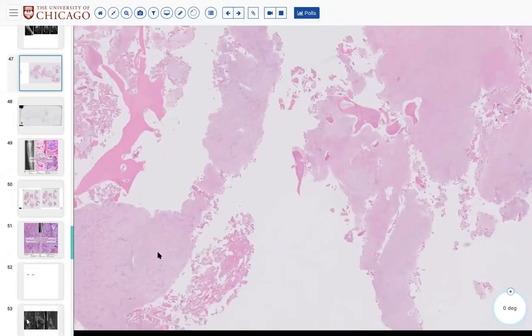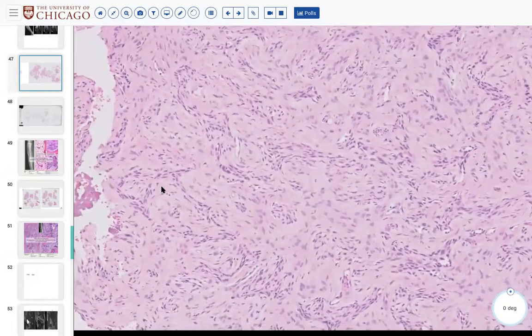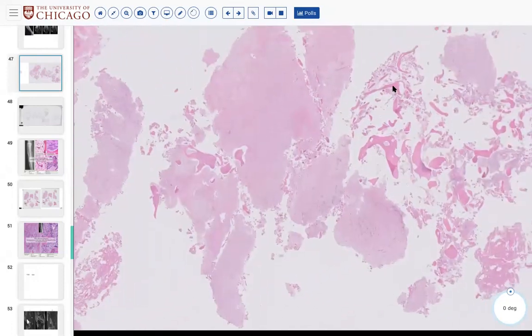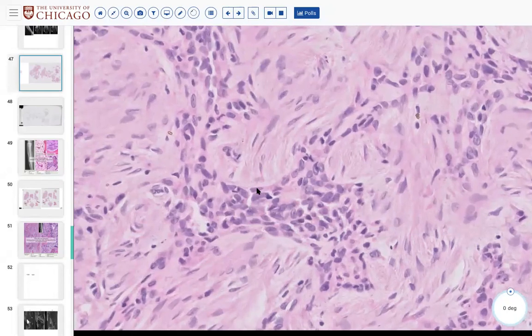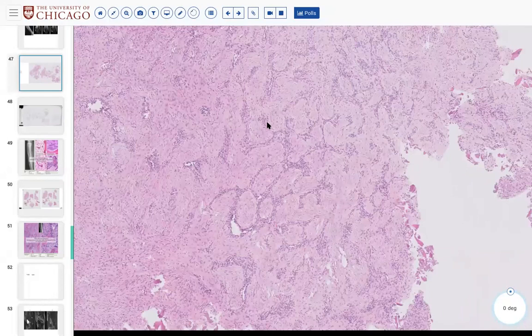But when you really evaluate the tissue thoroughly, you'll see that these compressed islands pop up here and there. On occasion, you may think, are these compressed blood vessels? And on occasion maybe they are, but some of them don't really have lumina. In that area over here, which I think is probably the best, they are multi-layered. You really wouldn't expect an endothelial vessel to have 1, 2, 3, 4, 5, 6 cells across as a cord. So that's suspicious. And again, this clinical situation is extremely characteristic for this lesion.